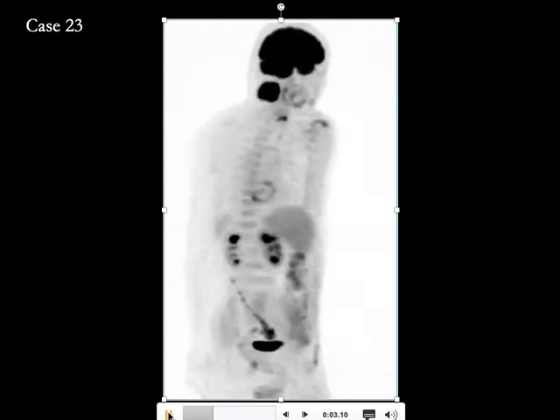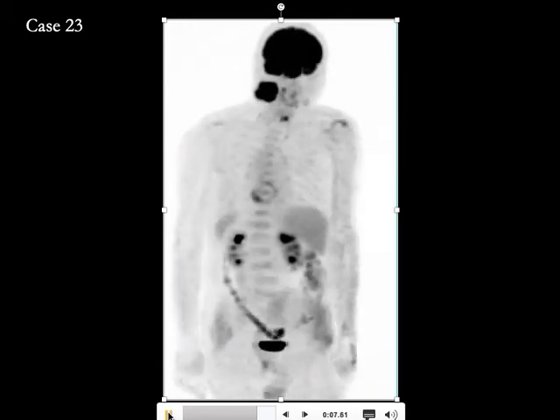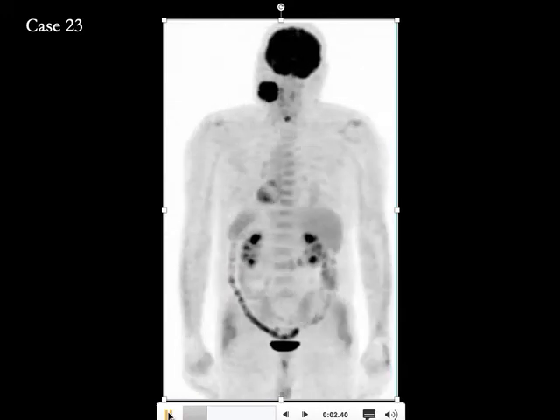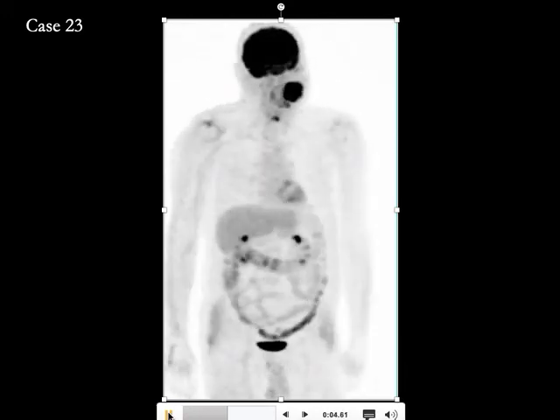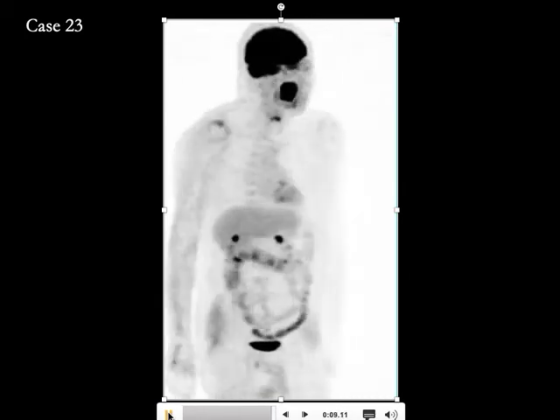Frequently, patients with head and neck cancer present with metastatic lymphadenopathy as swelling on one side of the neck, which is biopsied, and the question is, where is the primary? Sometimes the ENT surgeons go in and biopsy multiple sites inside to find the primary, but FDG PET is also helpful in localizing the site of primary.